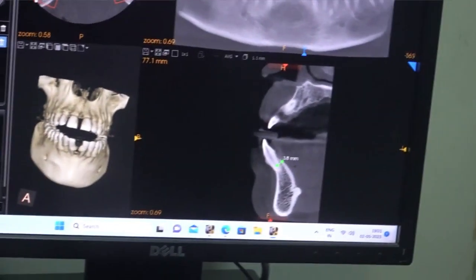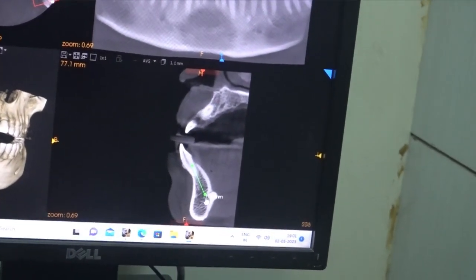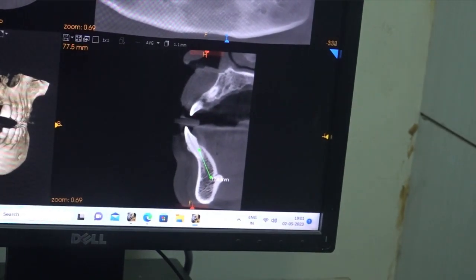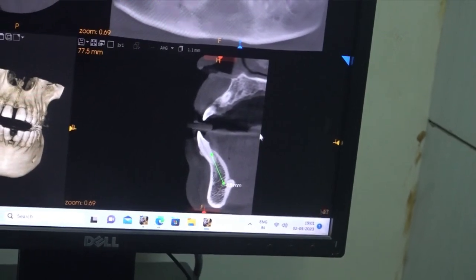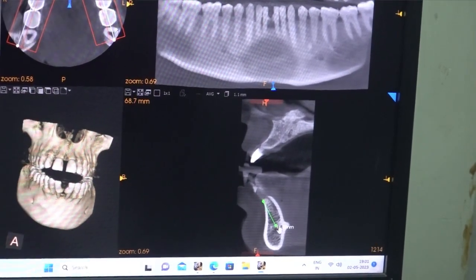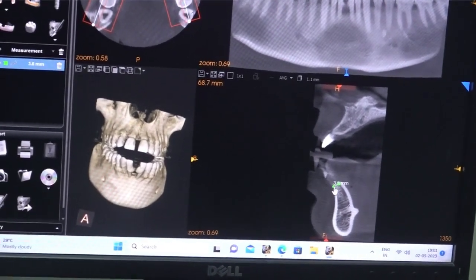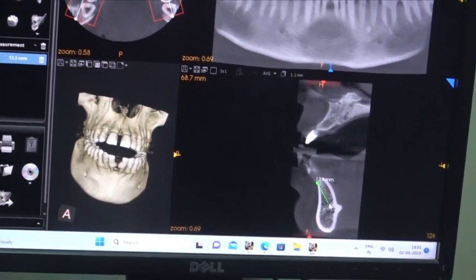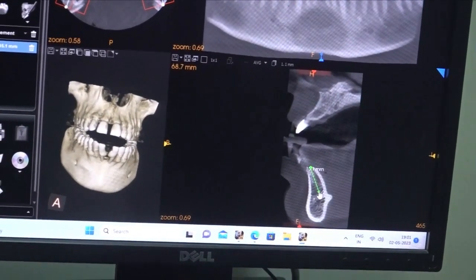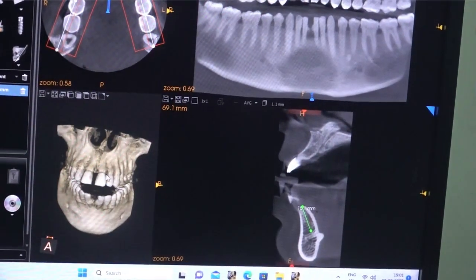Here also the same plan. Okay. Through the apex we are going, the angulation is correct. Okay. So till 18 it goes. Okay. So in the middle, what implant do you have to select? Definitely here not 4.2. 3.75 will do, or with some other brand we can select 3.5 also. 15 or 13 or 12, whatever it is. It's just an additional implant. Very small diameter.